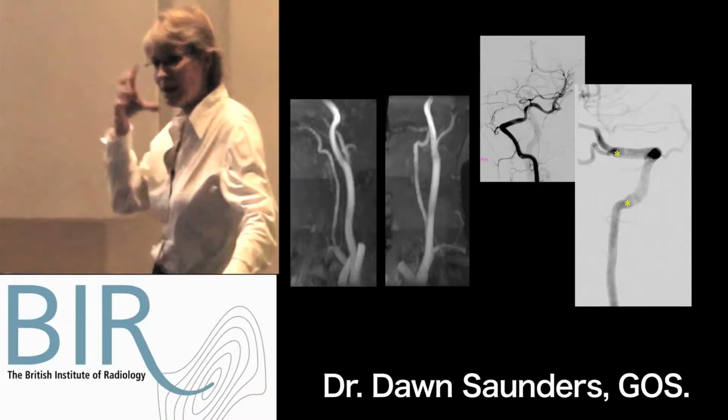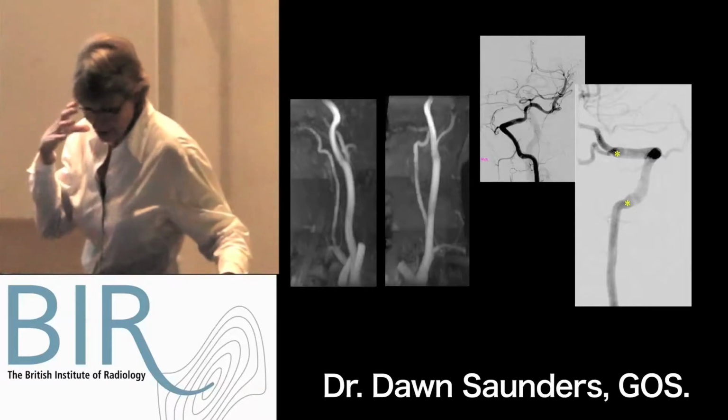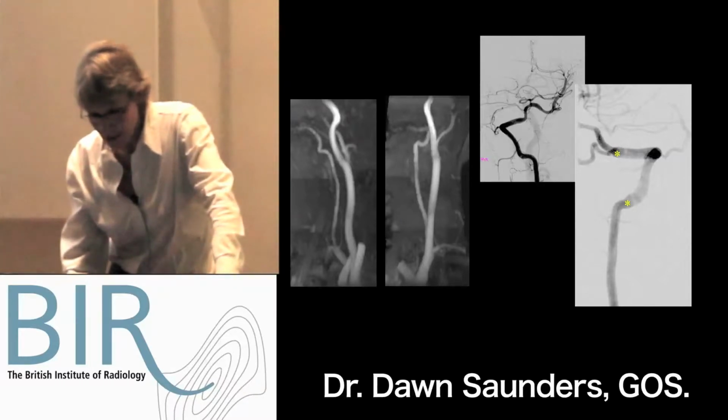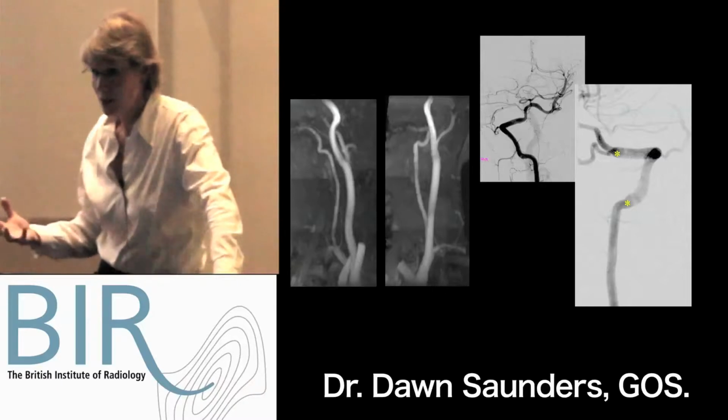The overlap between the intra and the extracranial vasculature wasn't at that time very good, so we missed the crucial areas, and you can see that you really couldn't fault these terribly much, but you could just say that you can't visualize them well.